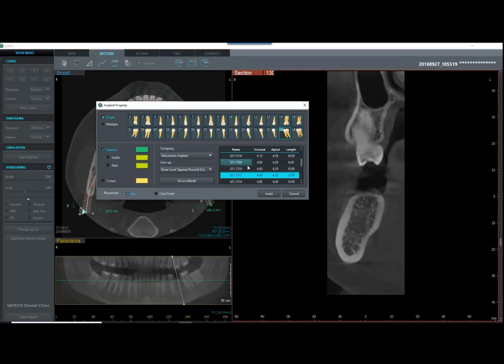I want to clarify one thing here. We have ours defaulted to Straumann. You can default your own computers as you go through these. We've just happened to default ours with Straumann through the set as default there. I didn't mean to cut you in here, but let's go ahead and place our implant here to insert. And you were talking about the axis.